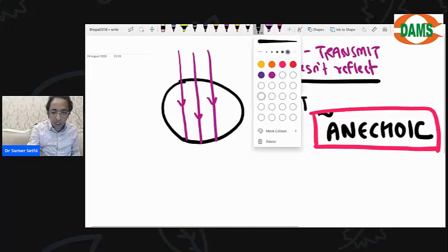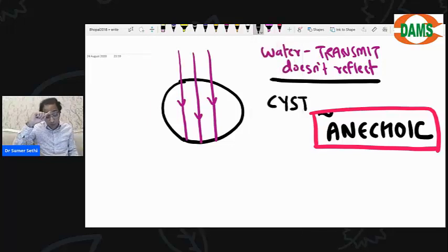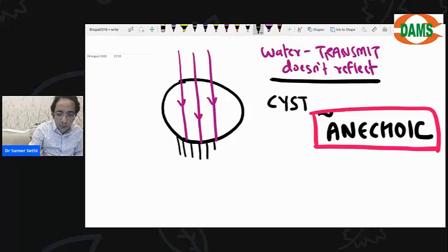Okay, now let's see if you can answer my question. I'm sure some of you will be able to answer. Because the cyst is not reflecting any sound, the amount of sound transmitted distal to the cyst is high.